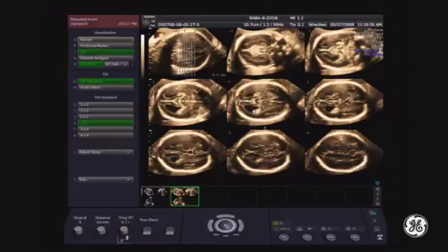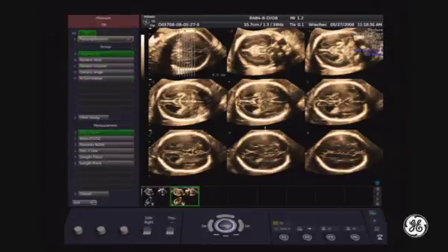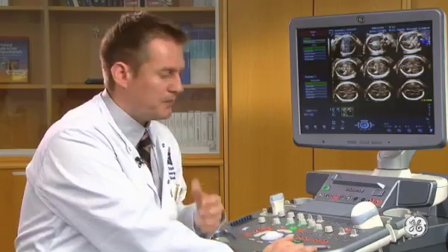We can measure them here. So I go to the generic distance, and I will measure this in the asterisk slice. The measurement shows the ventriculomegaly. And normally, as you can see, the cases are referred because of the ventriculomegaly, but here we have the abnormality of the brain behind. So by multiplanar approach and by tomography, you can discover the characteristics of this anomaly.